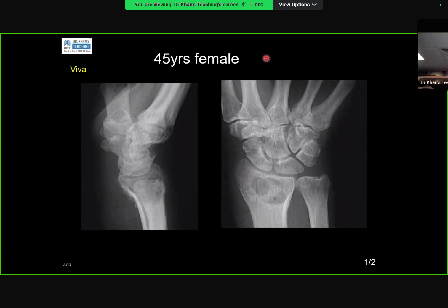Provided frontal and lateral projection of wrist with proximal hand showing an ill-defined lytic lesion involving the epiphysis of the distal radius with a wide zone of transition and a thin rim of sclerotic margin. And also there is an associated cortical break along the lateral cortex. No matrix mineralization, no soft tissue component.